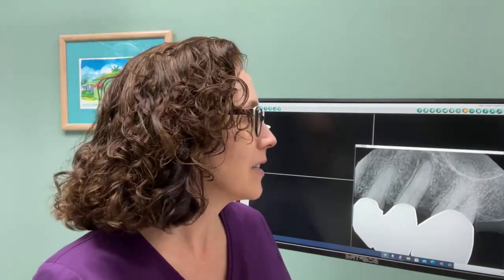One of the wonderful things that x-rays really allows us to see is when a patient has an infection. And so sometimes a patient can have an infection with a tooth that causes a lot of swelling or a lot of discomfort, and then we know that there's a problem. But sometimes there can actually be an infection without any swelling or without any discomfort. And what it does is it actually kind of dissolves the bone at the tip of the root. And so that can be considered an abscess.